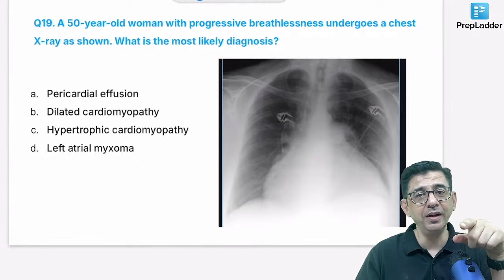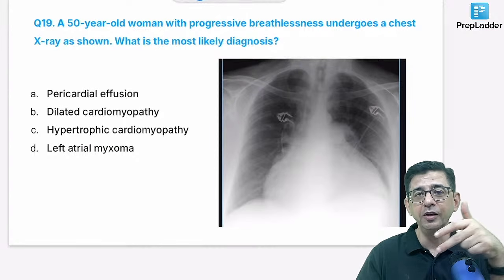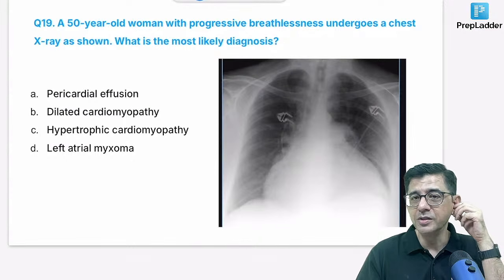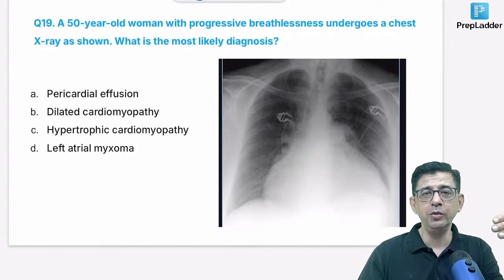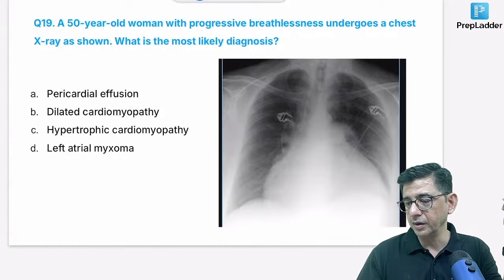Like I said, hypertrophy, right? Whenever there is left ventricular hypertrophy, there is inferior displacement of the apex. Here the cardiothoracic ratio was increased, it was a grossly dilated heart with no significant changes in the position of the apex. So it's a hypokinetic apex, it's a damaged heart. In hypertrophic cardiomyopathy, it's an inferior lateral displacement that you would be able to pick up in the left ventricle.